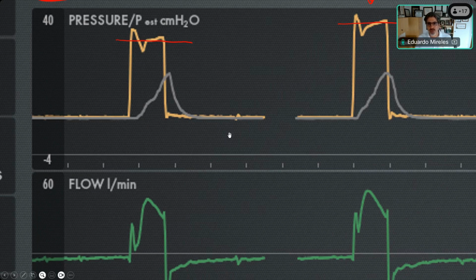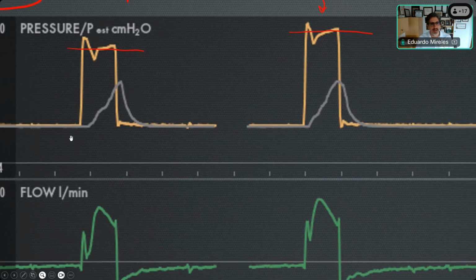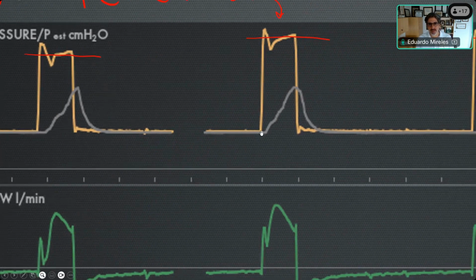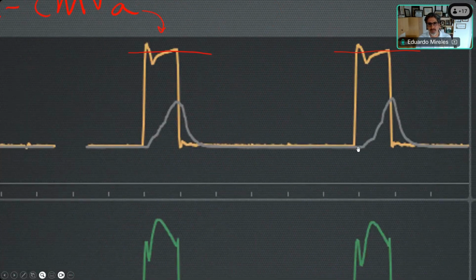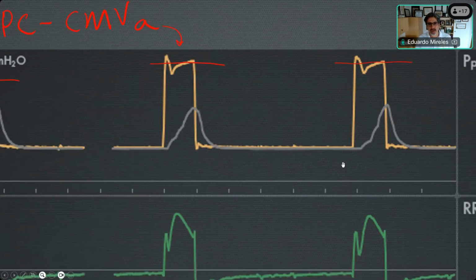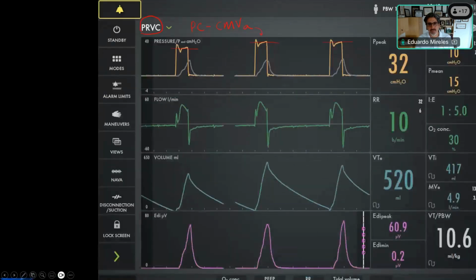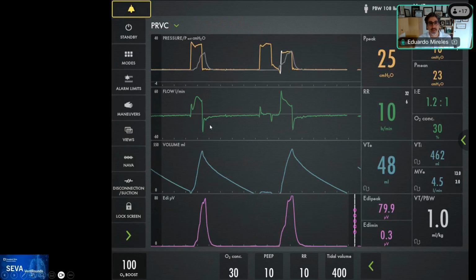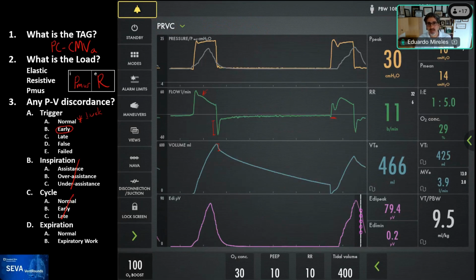But do observe, and this has relevance when we talk about phenotypes of early trigger and where they occur, that you'll see different timings of that early trigger. You see how different it occurred on this one. If I go to our prior example, just for the sake of observing it, you can see the difference between this one and that one, and this one.